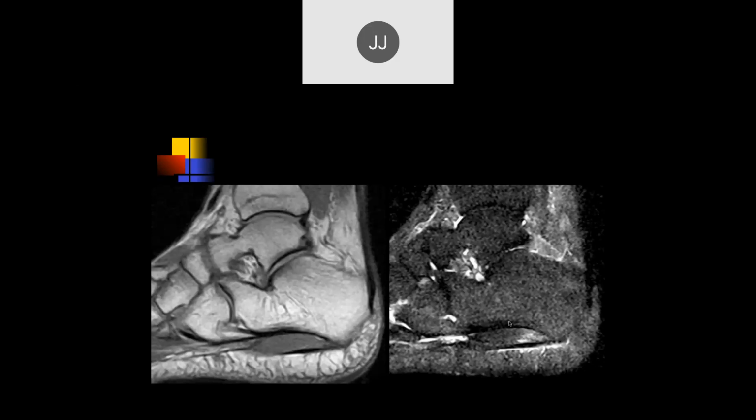By the way, the patient was much more symptomatic after the surgery than before the surgery. No doubt about it. We have edema at the origin of the plantar fascia. Okay, so we can see some edema along here. Also, there may be some here in the muscle.